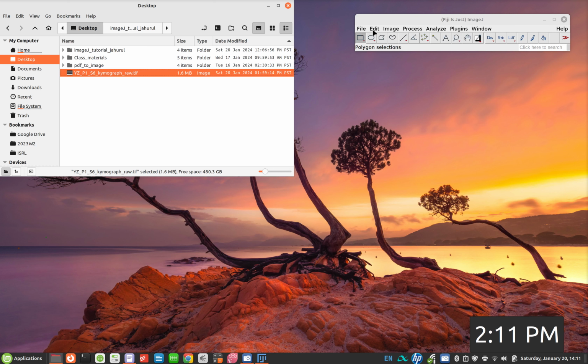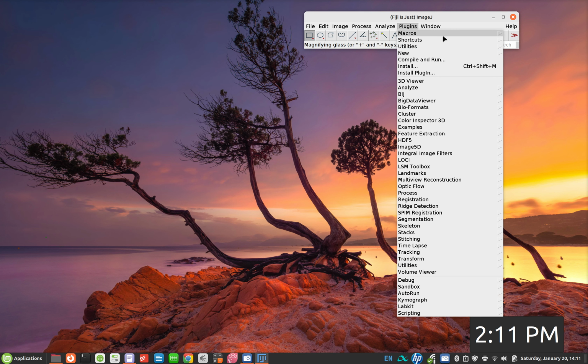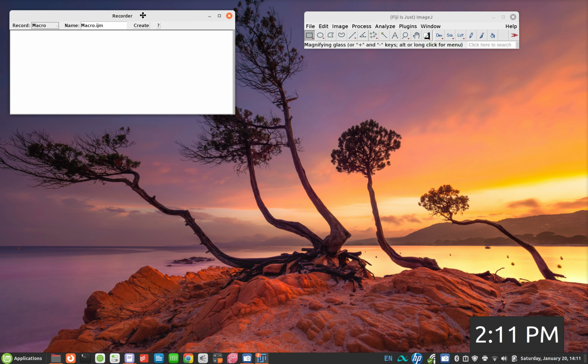So we load the kymograph into ImageJ, but before we do that, we can do one single thing, that is enabling a macro, that means recording the activity that we're doing, because sometimes we want to have some records so that the results are reproducible. So enable that if it is possible for you. Otherwise, don't bother for now. But let me know if you need help. Okay.